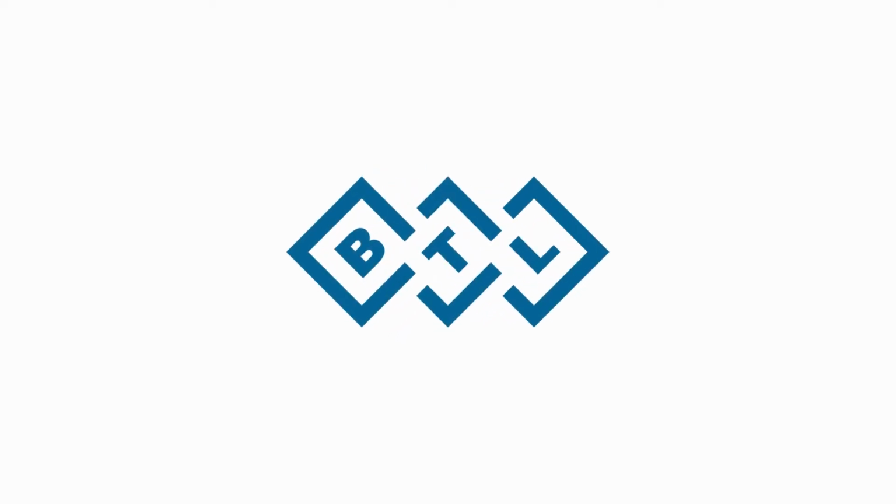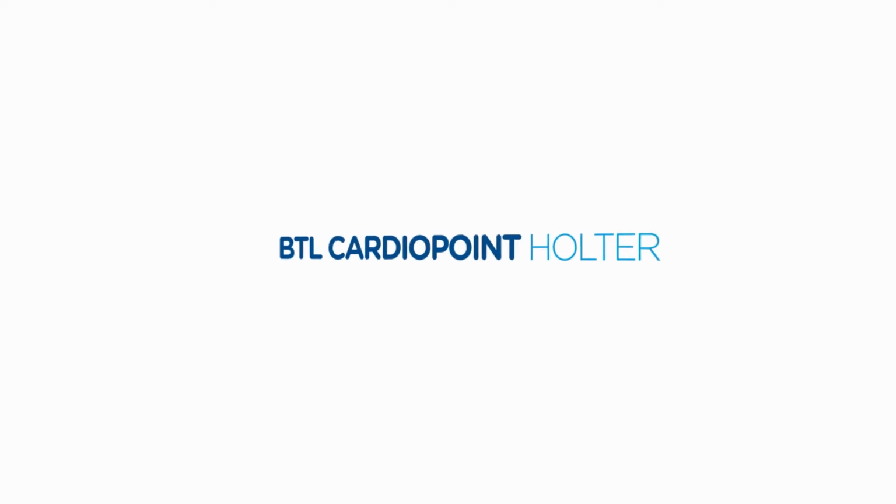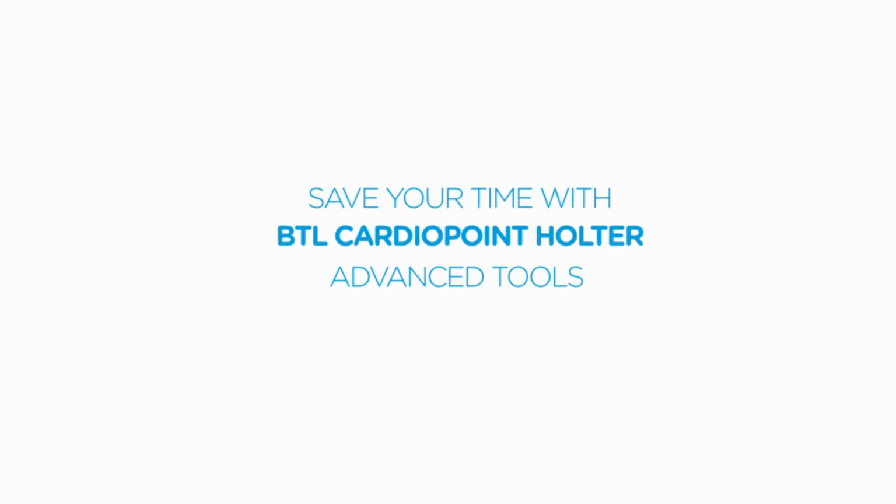Hello! In addition to the basic Holter analysis that we reviewed in the previous video, BTL CardioPoint Holter also provides a unique set of advanced diagnostic tools that are easy to use and do not require any additional training to work with them. With this video, you can start using them right away and significantly save your time.